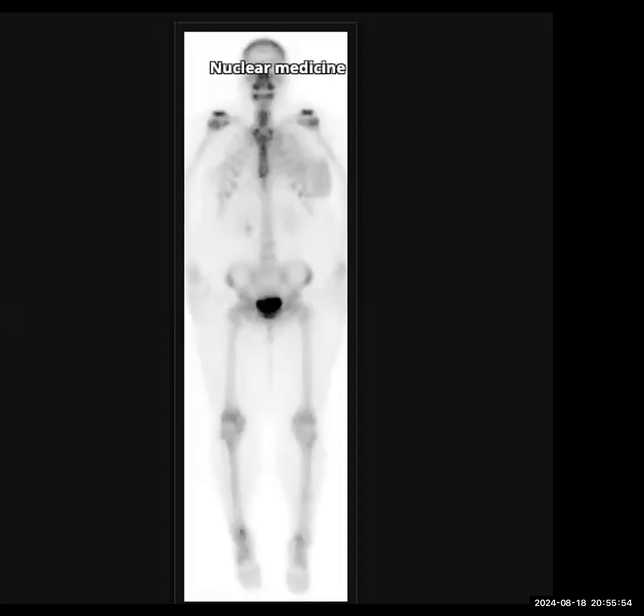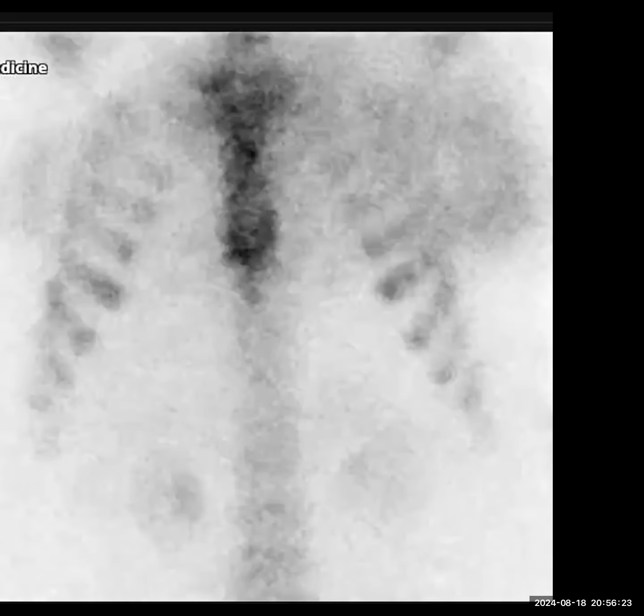Could you ask for control and show me where you think the abnormality is? Okay, I think this is the abnormality. What do you think it is? If it was a female patient, I would be thinking in terms of breast carcinoma with lymphatic uptake. That would explain this. In my routine practice, I would correlate these findings with... I can give you a closer view.